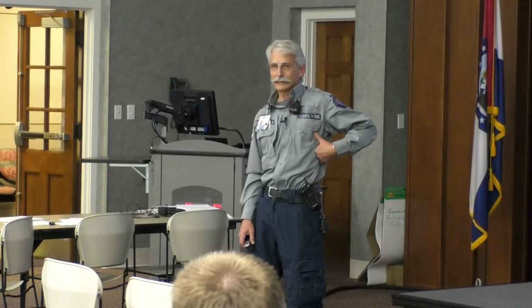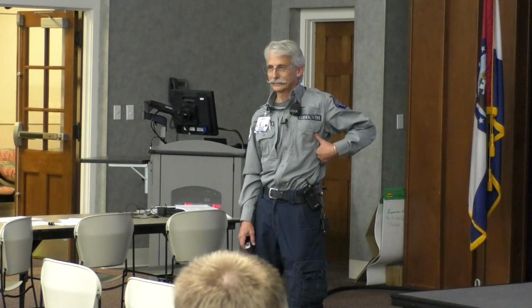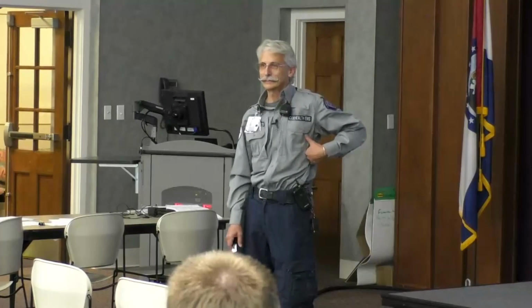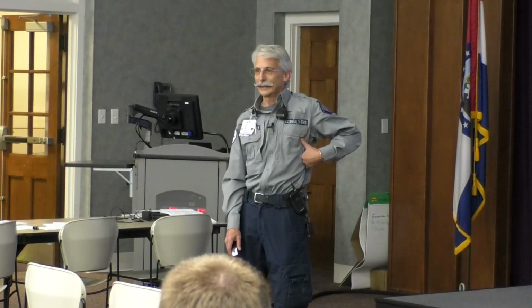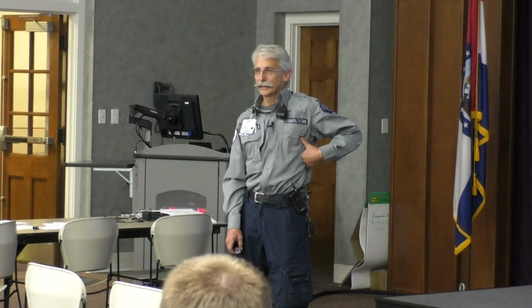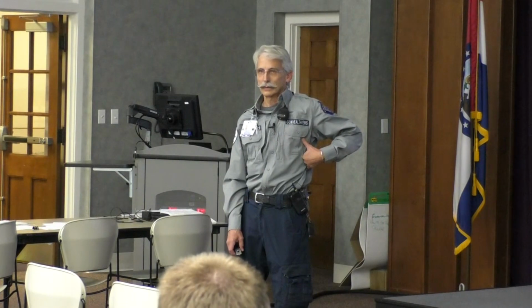What do we call that? The widowmaker. We do call it global. This person's major artery is occluded very high. We've got to get this fixed soon.